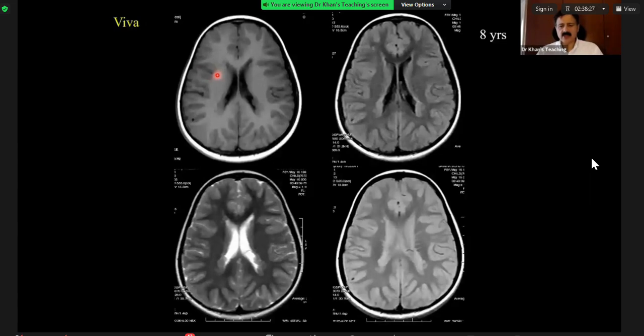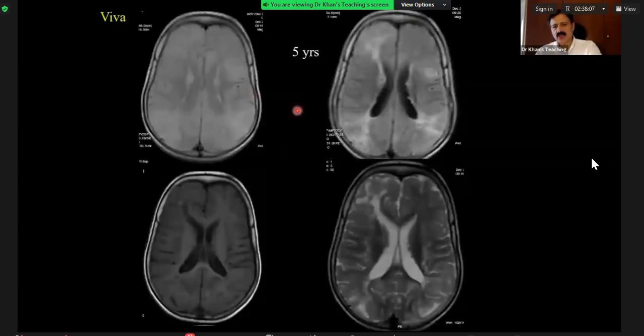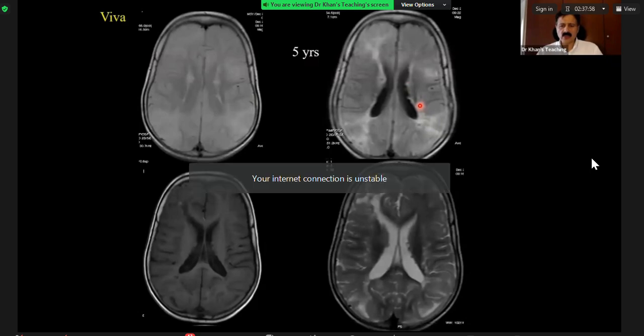And please remember, this case also has come in the exam as a CT scan. I'll show you later on in the congenital. And it becomes, the eye sees what the mind knows. So this should be a sort of a review area for you to see the subependymal region. So here, just if you go back, the subependymal nodules of tuberous sclerosis will not be equal to the gray matter.